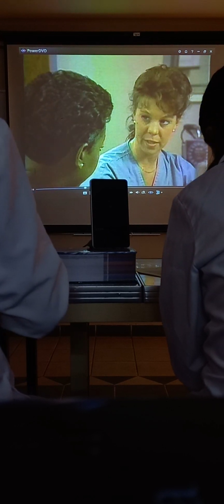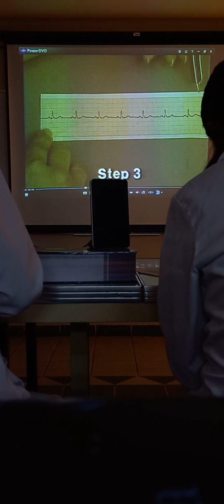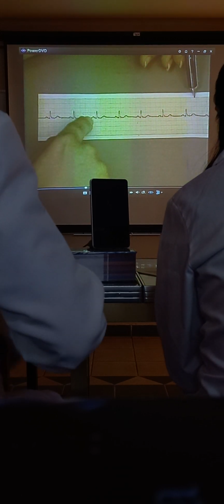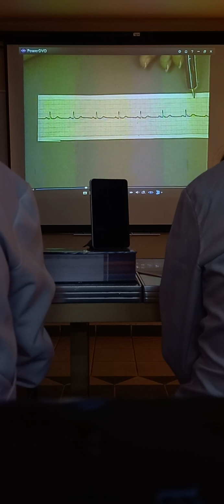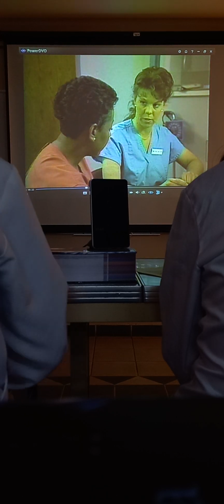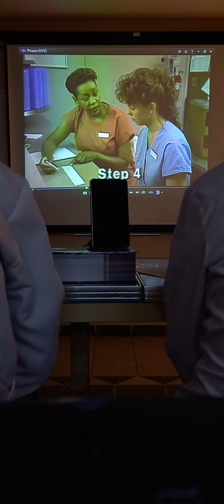The intervals seem to be the same. Does that mean that the atrial rhythm is regular? Yes, it does. In step 3 of the assessment, you determine atrial rate. A rapid way of determining the rate is to count the number of P waves in 2 3-second segments and to multiply this number by 10. I count 7 P waves, so the atrial rate is 70, within the normal range of 60 to 100 contractions per minute, right? Right. Step 4 is calculating the duration of the PR interval.